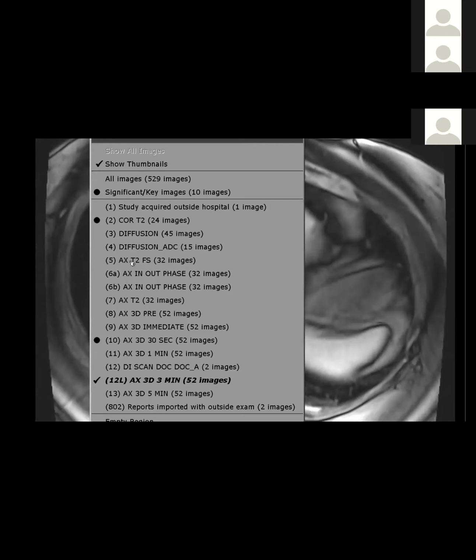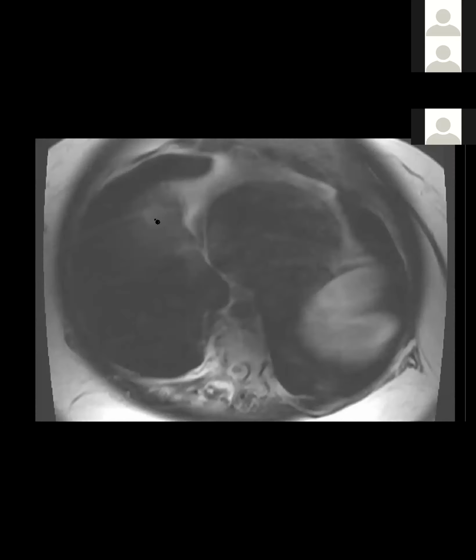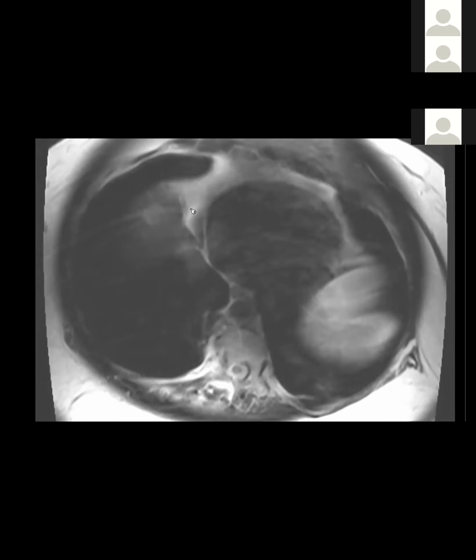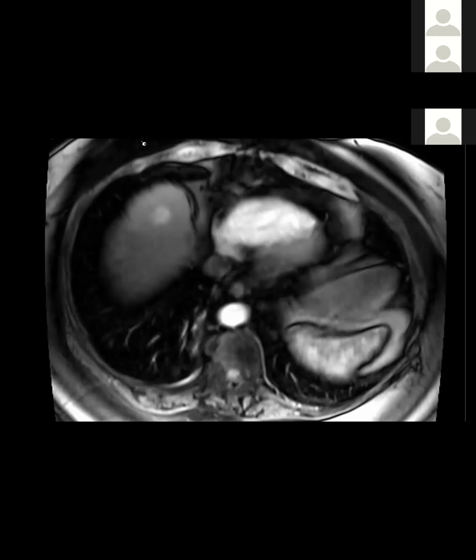The only thing that's not quite perfect for hemangioma on this scan is that the T2 signal is not terribly bright. But I personally have seen hemangiomas that don't have such a bright T2 signal. So I don't think that if I'd seen this case, I would have raised any concern other than calling it hemangioma and being done with it. I think this is what happened in 2013: they called it hemangioma, and the patient went on their merry way.